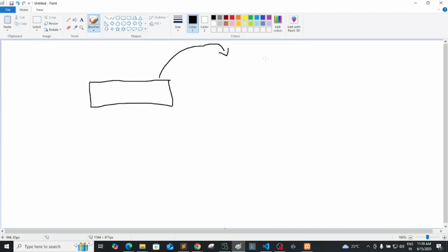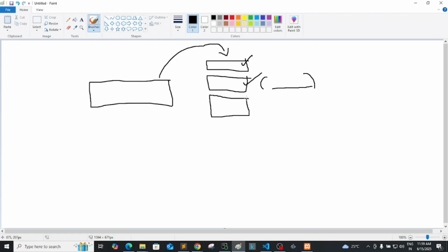So for that we will have a sequence of processing. First we do grayscaling, then we apply an enhancement technique. This is a very special enhancement technique. I won't give a name here. And after enhancement, okay, let me tell you: I am using CLAHE.